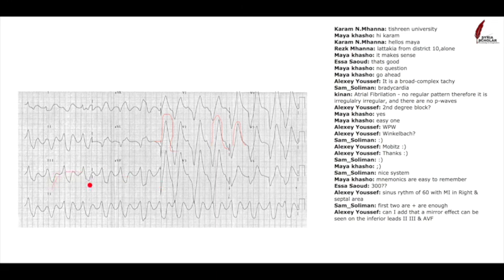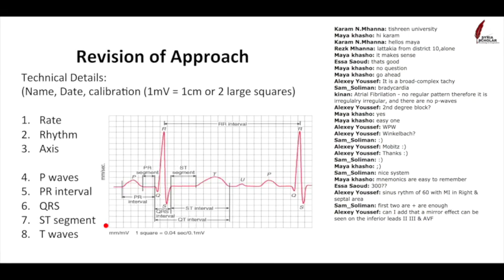what we call sinusoidal. It looks a bit like a sine wave. It just looks like a long, slow sine wave like this, because it's being stretched out and very broad with these peaked, tented T waves. And that happens in hyperkalemia. But again, that's something that is a bit more for detail.